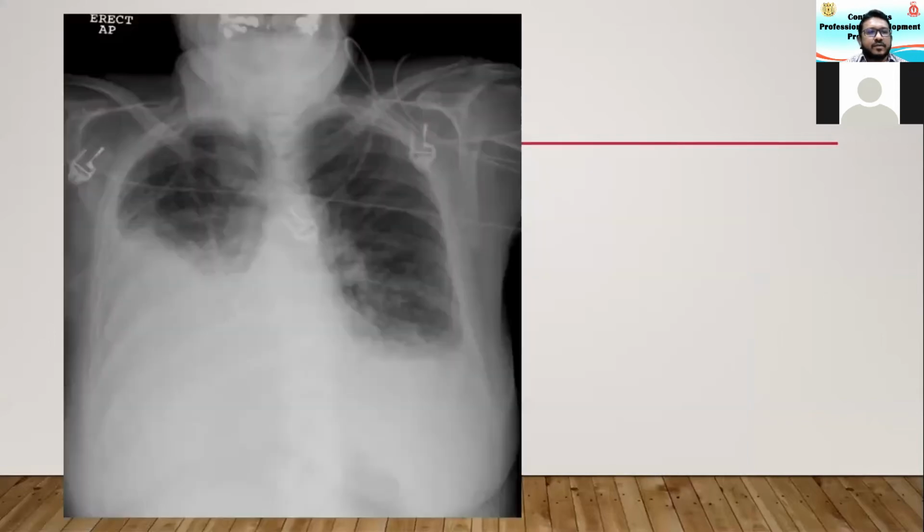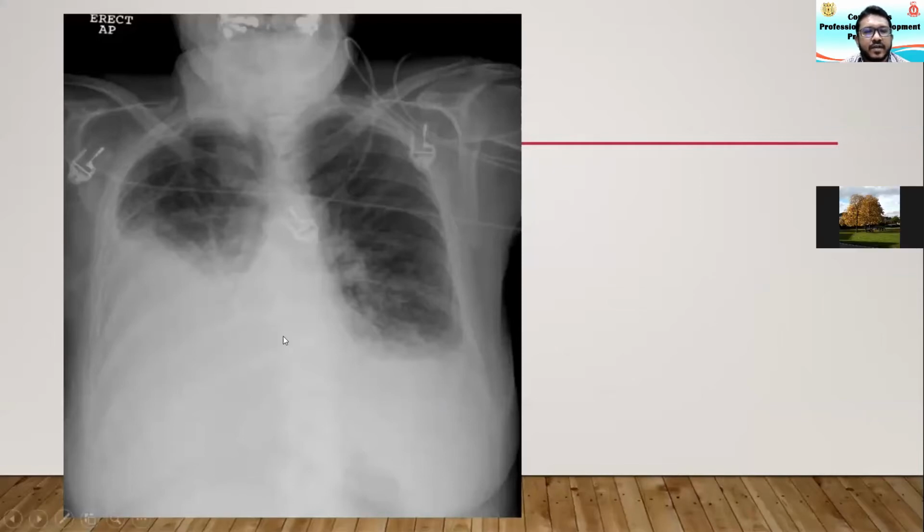So moving into some of the pathologies, this is a very common presentation in an OPD setting. An adult patient coming with breathlessness, and you do a chest X-ray, so you will find this. So what do you think you have here? If you go in order, you see the airway is quite central, but it looks like a bit of a rotated X-ray. But then the cardiac outline is obscured, and the diaphragms are both obscured in this.